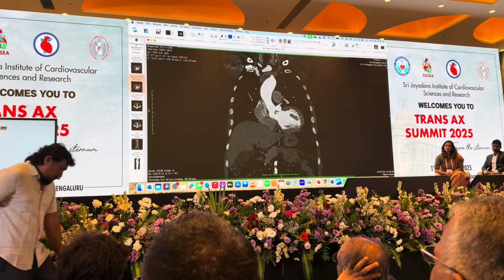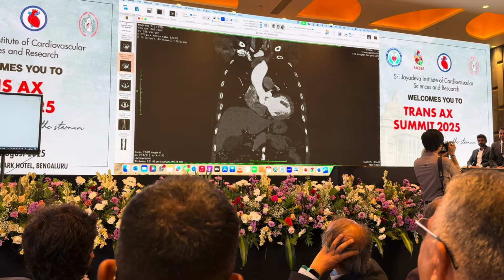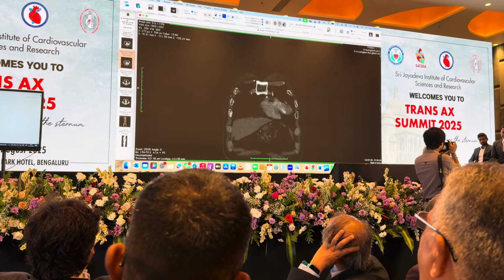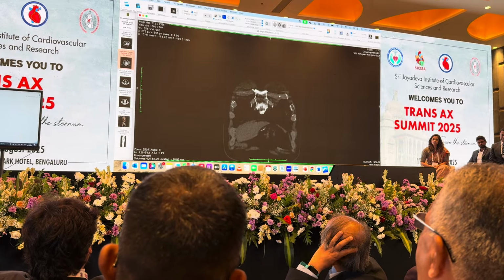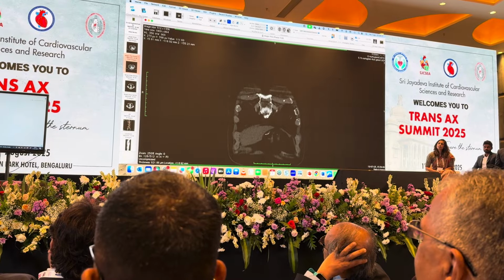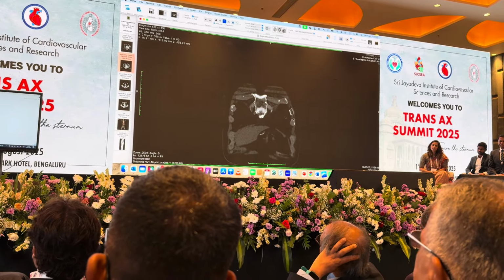To understand where your target is located inside the chest. So just an example, this is the aortic valve. I drop my pointer here, I scroll, look for the sternum, so I see where the aortic valve is below the sternum. Very easy. So when I'm approaching the patient, I'm going to the patient's bed, I put him in the right position, I already know, maybe I start thinking, okay, I know the aortic valve is there, and I'm entering the chest from here. I'm in the right position.